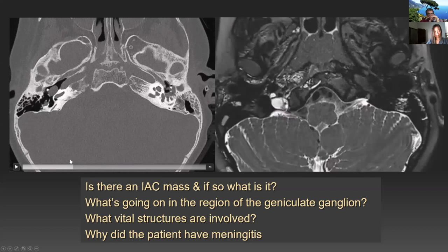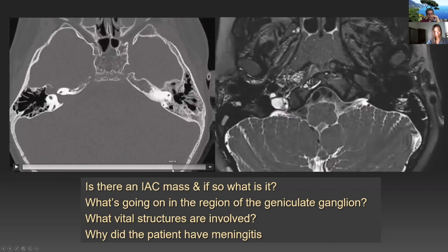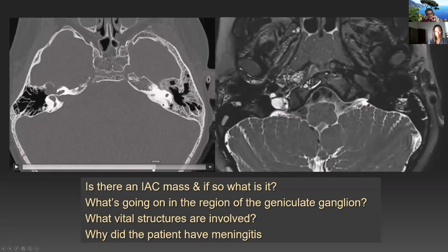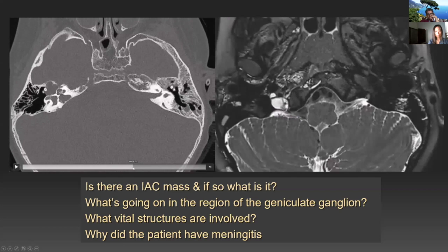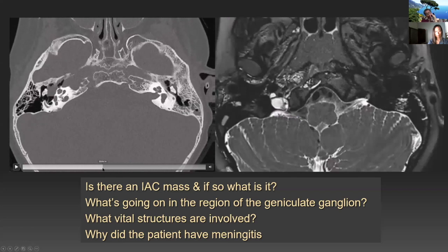Now, in terms of what we think this is, well, our presumption is one of two things. One is the bone is abnormal because of an underlying low flow vascular anomaly. The fluid within these spaces does not enhance, so we thought it was a lymphatic malformation. Or two is the same question as Felice's group had: could this have been a long-standing erosive osteomyelitis that had been neglected and ultimately led to these secondary meningoceles?